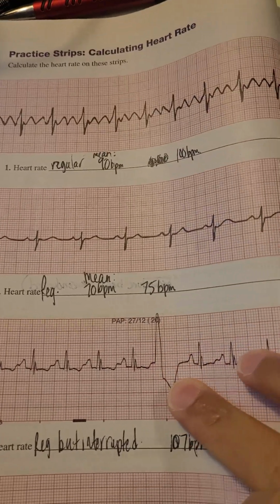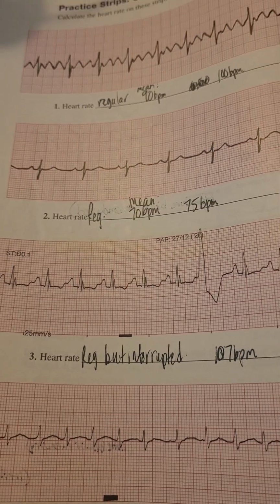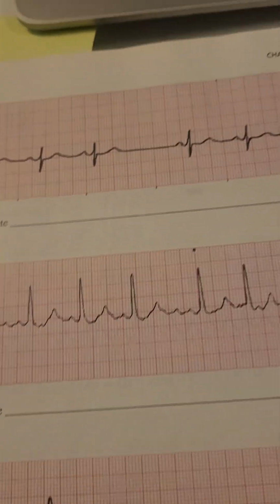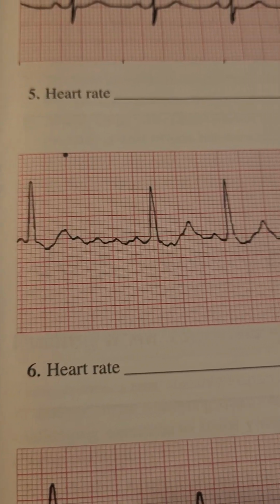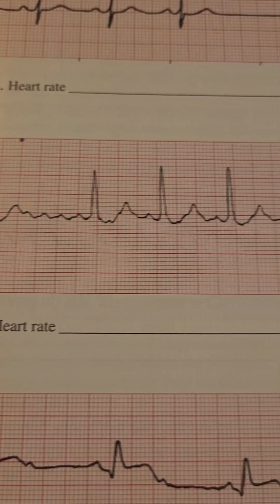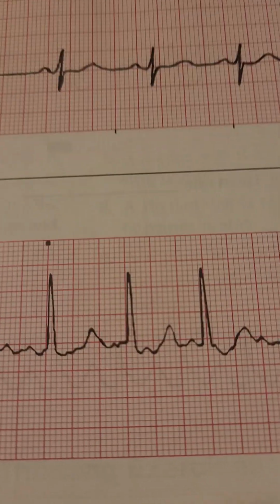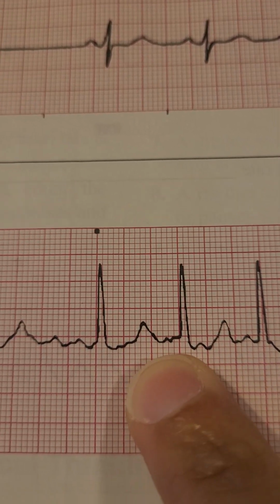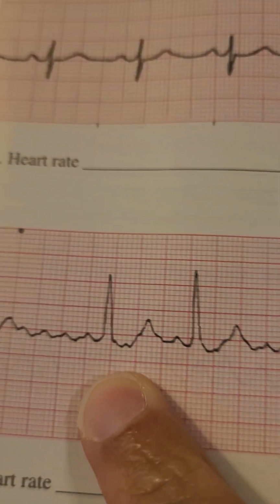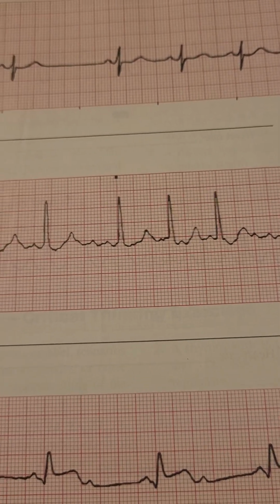Now this PVC is the same thing as the other one, but like I said, some of them look different. So we'll get into more of these a little bit later. This one, the wiggly lines again, you'll see the name for that. It's not consistent. As you could tell, there's no P waves, or maybe there is P waves, but look at the way this one, you don't see any more. You see wiggly lines for the most part. So this is irregular. That's regular.